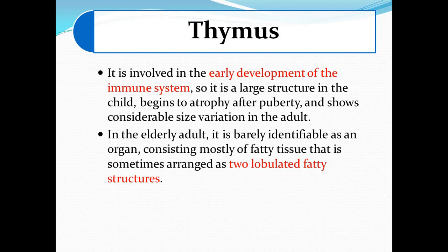So the density on CT and the signal intensity on MRI will correspond to the fat content of it. So it will have hypodensity on CT, and it will have chemical shift on MR sequences between in-phase and out-of-phase images.